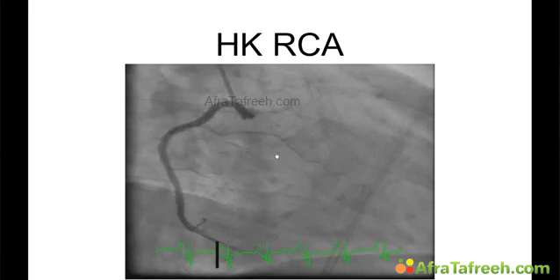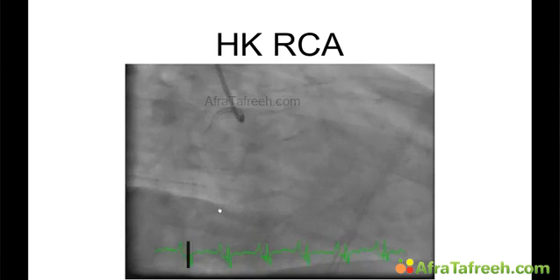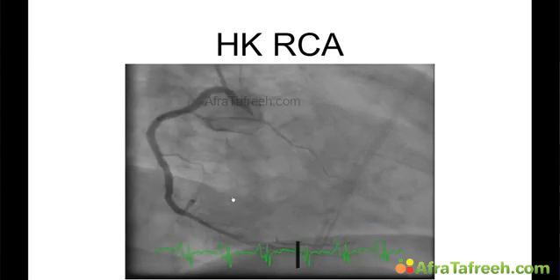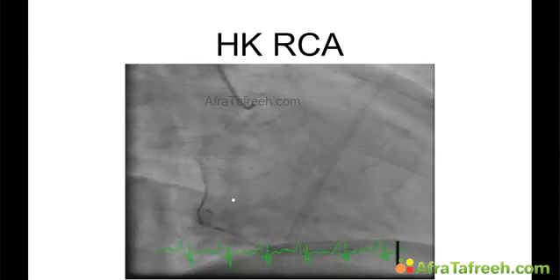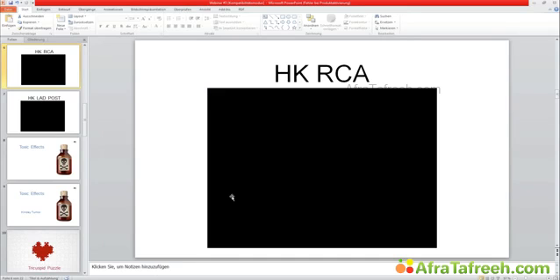There is no abnormality here. Now, one thing you should also know is if you have a normal coronary artery, it does not always necessarily mean that there is not some form of problem in this vessel, because it could have been that the vessel was reopened. But in this instance, I think one thing is clear: the culprit lesion is the LAD and the circumflex artery.